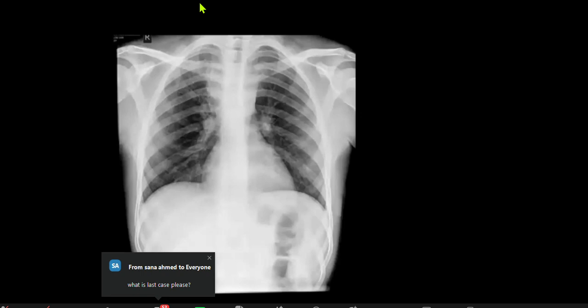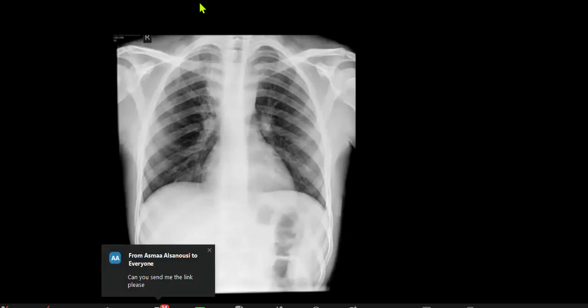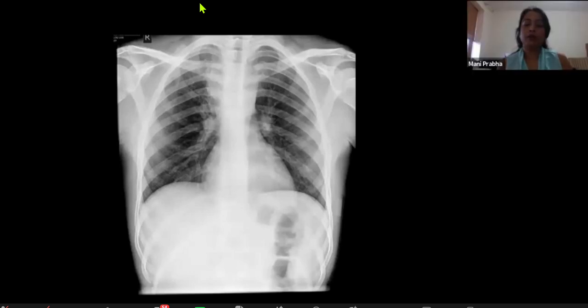Okay, so this is a frontal radiograph of an older child. The right paratracheal stripe appears expanded, and there's bilateral symmetrical hilar adenopathy. There's also increased lung markings bilaterally, which appear symmetrical. Given this appearance, my differentials to consider would include sarcoid and TB. What will you do next?